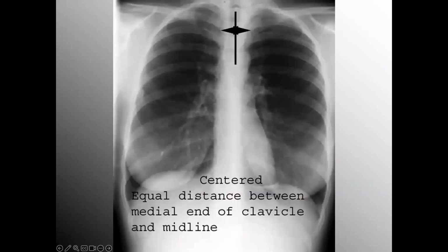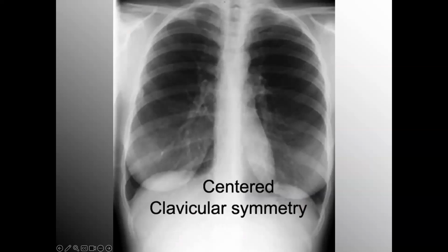Just a good reference slide. You want to see that the clavicles are centered, they're on the same level, called clavicular symmetry. With clavicular symmetry, it can be skewed if the patient's malpositioned in the bed.